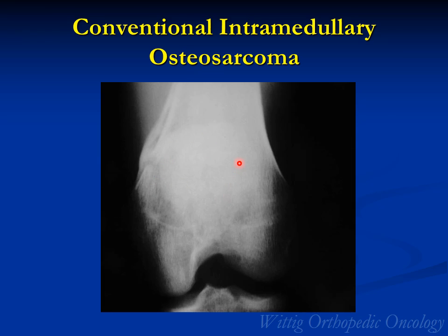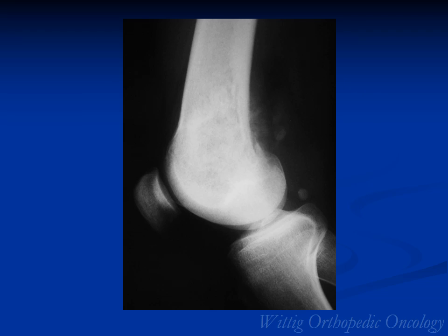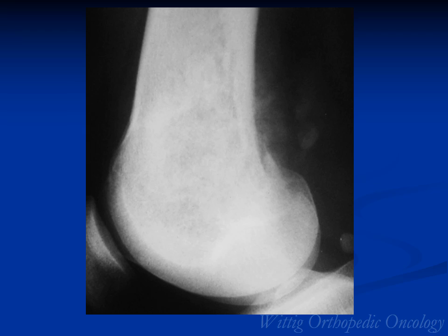It's a conventional osteosarcoma, which is a permeative lesion, and you can see the fluffy cloud-like area in the soft tissue component and the subtle sclerosis in the medullary canal, which is indicative of ossification. Lateral X-ray, where you can see the tumor has protruded through the posterior aspect of the femur, and you can see the fluffy cloud-like density in the posterior soft tissues, indicative of an osteosarcoma.